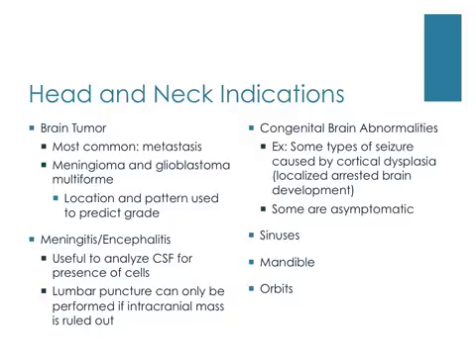Conditions affecting other components of the head besides the brain are commonly evaluated by CT, and these include the sinuses, mandible, and orbits. Regarding the sinuses, CT images are helpful to keep the surgeon from inadvertently entering the brain or orbits during a sinus surgery that they are performing. And this surgery is often performed with direct correlation to CT images. The mandible isn't optimally viewed with plain films. It's very hard to see exactly what is going on with the mandible in general X-ray films, but it is much better seen on CT images, especially CT images that include 3D reformations.